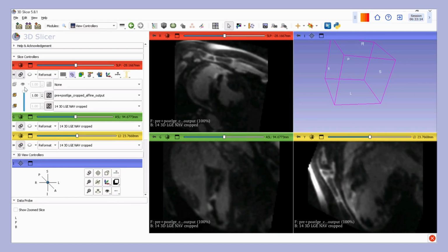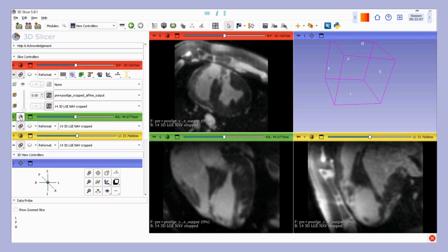It's very qualitative in nature. And as you can see, if you just do it, you can get a little visual on that. You can even add color to help you distinguish, if that makes things easier.